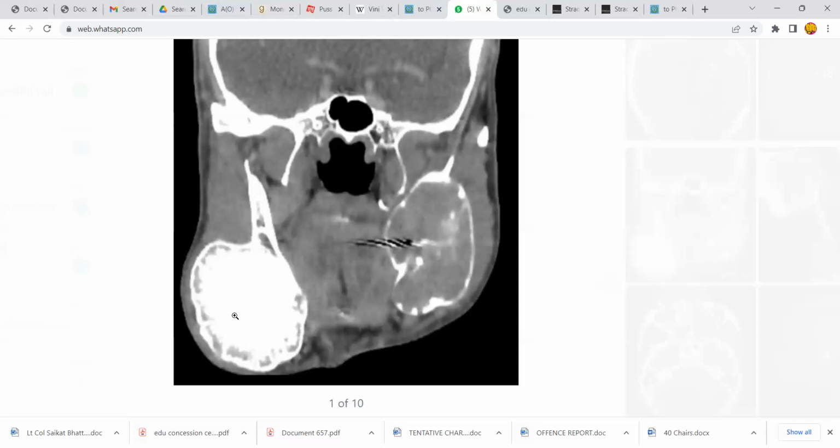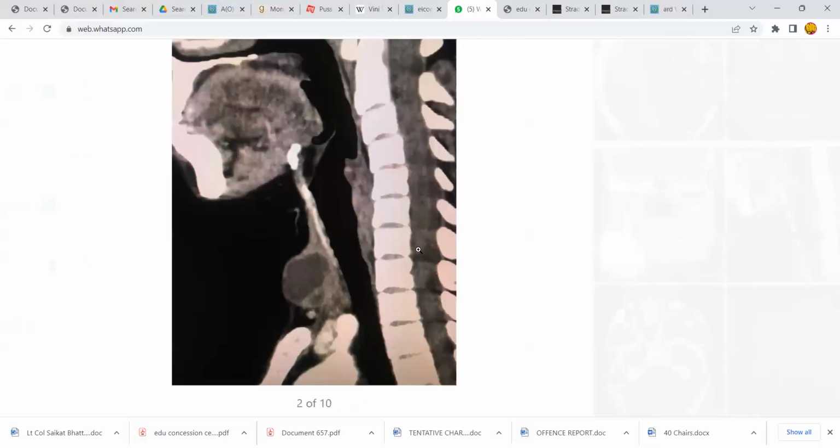Odontogenic. So this is like a mixture of lesions. I'm not too sure about the diagnosis. I think this should be an ossifying fibroma and this should be an ABC, GCT, or the rest of the expansile bony lesions that we have. I'll come back with the diagnosis, whatever this is. I'll let you know. Nidesh, this one?